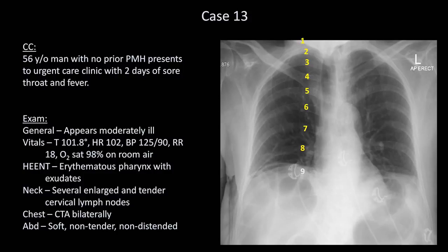There are 2 general explanations for this. First, the patient may not have taken a large inspiration, or the radiograph may have been poorly timed, or there is a pathologic process leading to reduced lung volumes. You should never assume the former unless the latter has been ruled out. Aside from the modestly low lung volumes, however, the lungs and heart are otherwise unremarkable. What is interesting, though, is this right here.